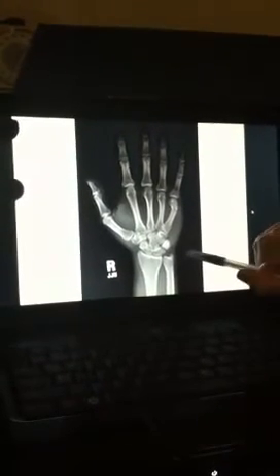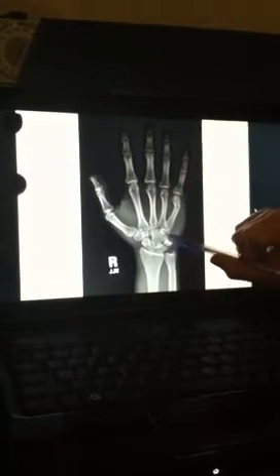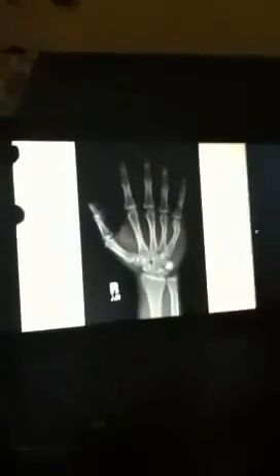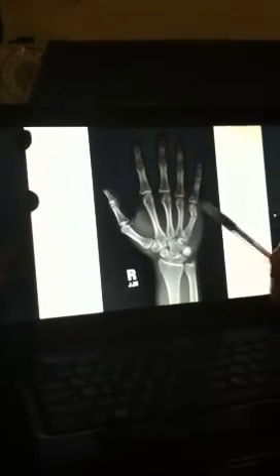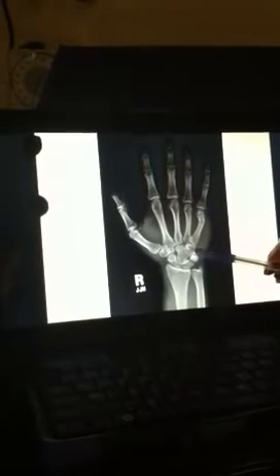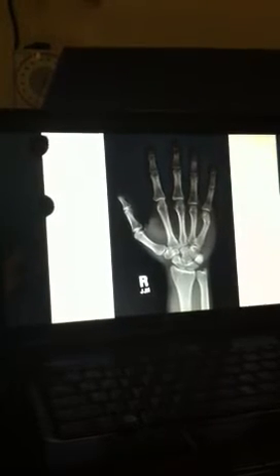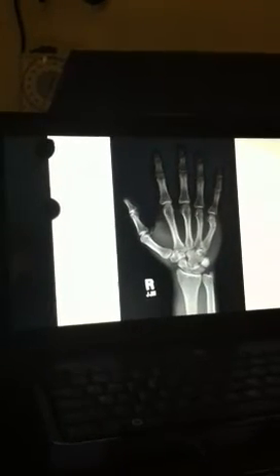The tricky part about the triquetrium and the pisiform is that they are kind of superimposed on each other, so it's hard to distinguish one over the other in an x-ray. On the models, it's pretty easy to distinguish them. Like this, there's a little bit more of a shadow here, that is the pisiform, and behind it is the triquetrium, or however you want to pronounce it. They just look like they're on top of each other.